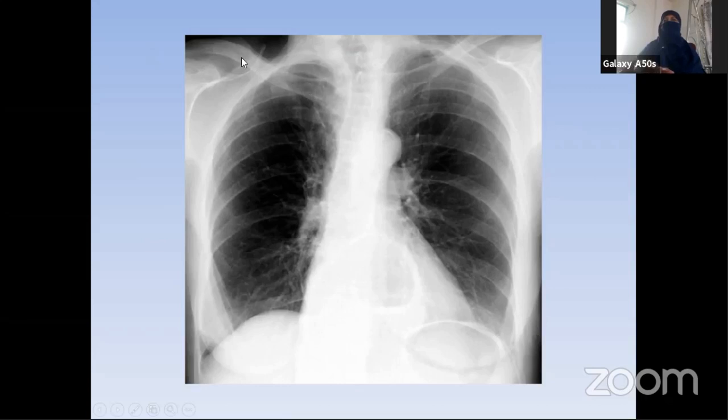These clavicles have some osteopenia, like reduced density because of some thinning. You see that these clavicular ends and the ribs are thin. This is part of osteopenia, and the medial ends of the clavicle epiphyses are fused by 40 years. So the patient is somewhat older.